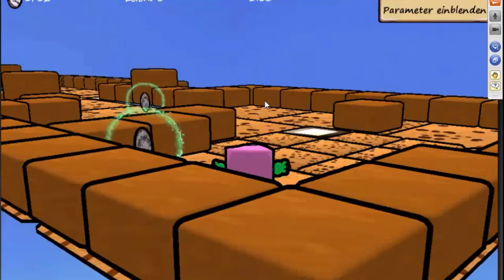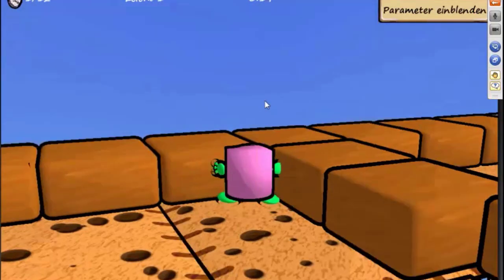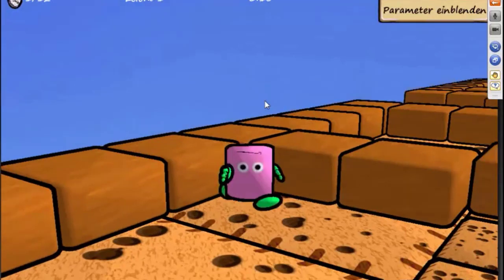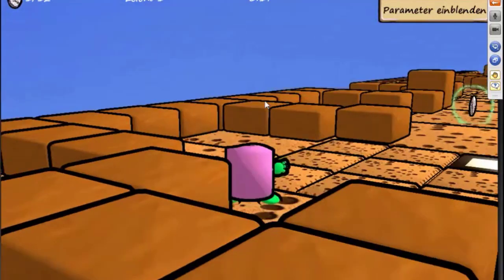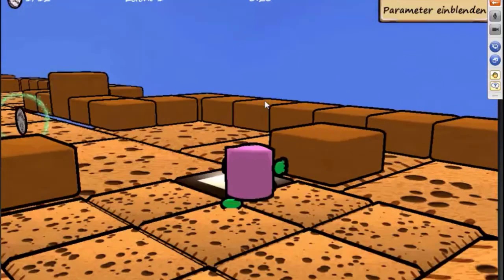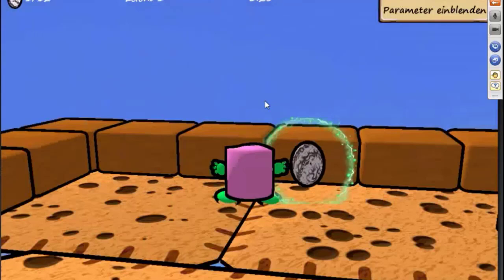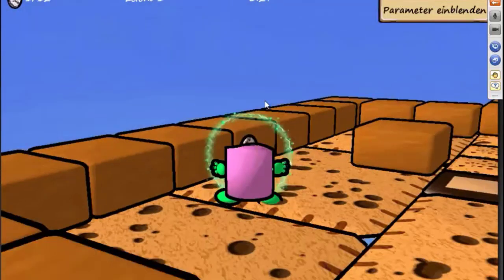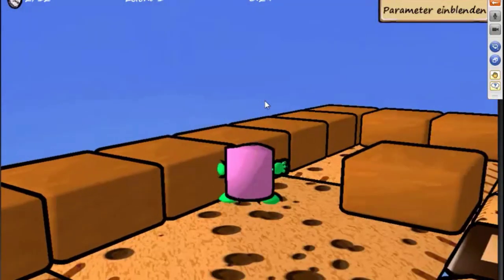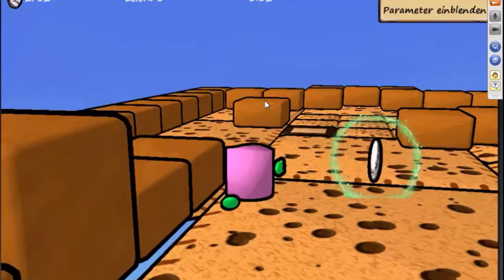And again, the mission is to collect the little chocolate pieces that are on the course. However, there are other skills involved. You, for example, need to find those white buttons in the ground. If you click them, things will happen, such as a new chocolate piece appearing or a new path opening. There are a lot of different aspects here. This is an easy level.